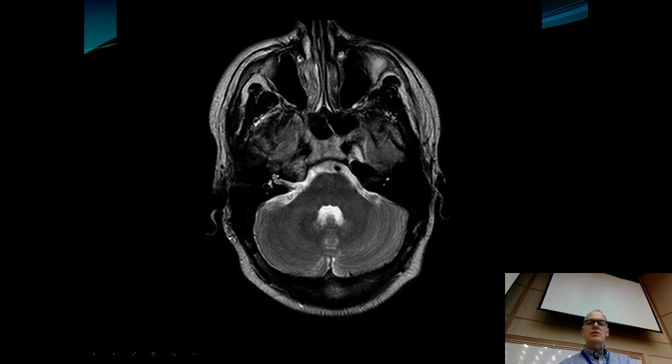This is actually the inner ear right here. You can see the cochlea, the semicircular canals. And so cranial nerve 8 is going right out into the inner ear in that area. Okay, and what we're looking at here is just the undersurface of the temporal lobe as we move up. Okay, and here are the internal carotid arteries again.